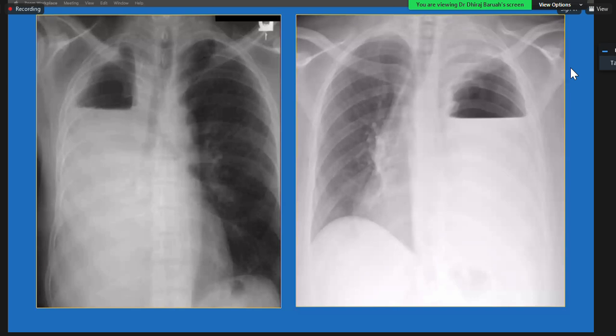One thing to remember is that in any patient after pneumonectomy or lobectomy, the air should gradually decrease. If you see any follow-up X-ray where the air is increased, then you worry about bronchial dehiscence or bronchopleural fistula. That is very important. In any post-lobectomy or pneumonectomy patient, you do not want to see increased air in the pleural space or soft tissues. Subcutaneous emphysema or pleural air should not increase after lobectomy or pneumonectomy.